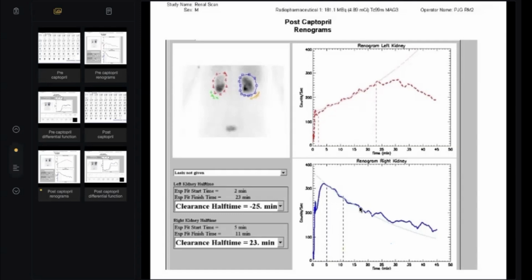The most important thing is not the parameter in comparison to the shape. After 5 minutes, you should start to excrete. The curve must decline. Even gradual or sharp, the most important thing is decline. Okay, this is normal. But what happened here?